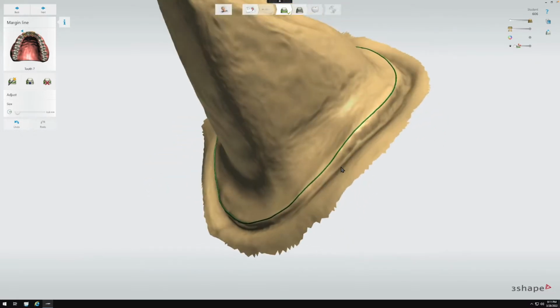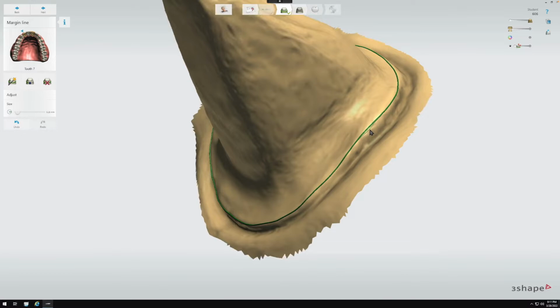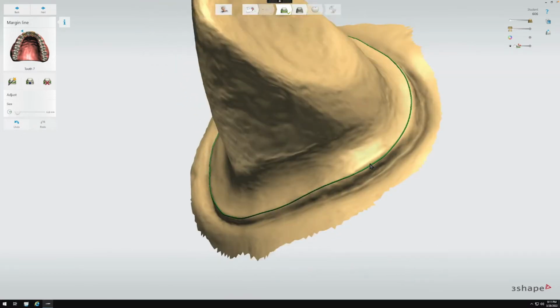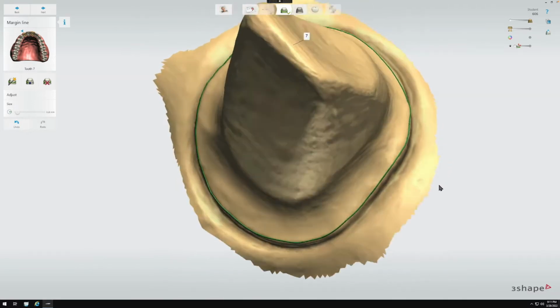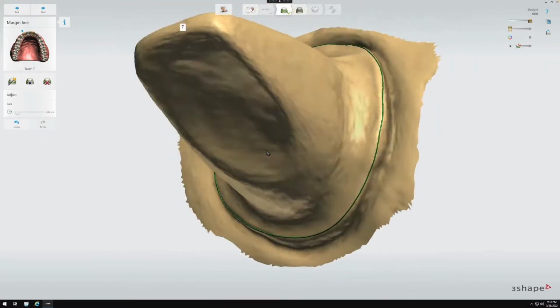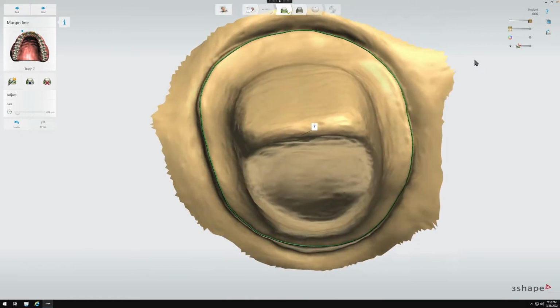It makes it kind of soft instead of nice and sharp like it's supposed to be. It'll kind of soften things up. So you want to be mindful of things like that. So yeah, a good HD photo is always helpful to help you determine whether or not something's actually a finish line or cord or something else.